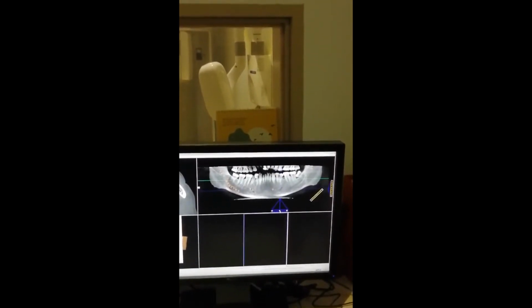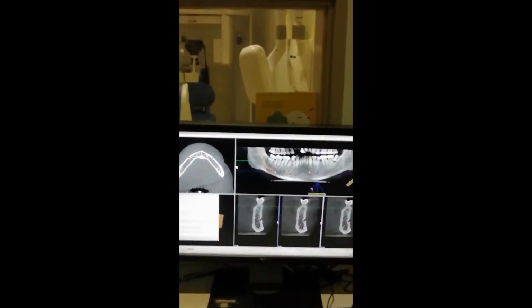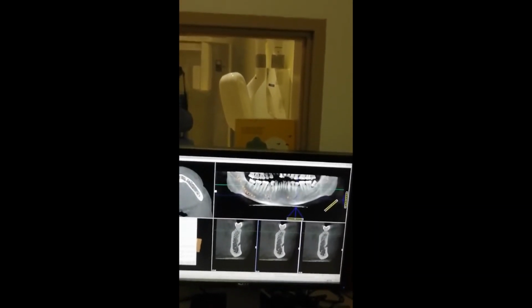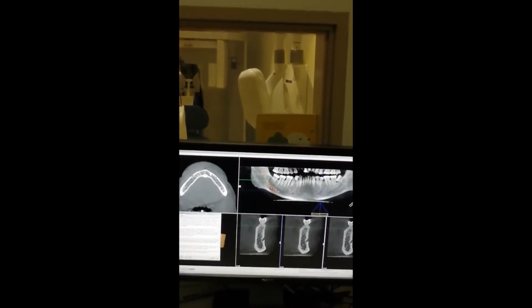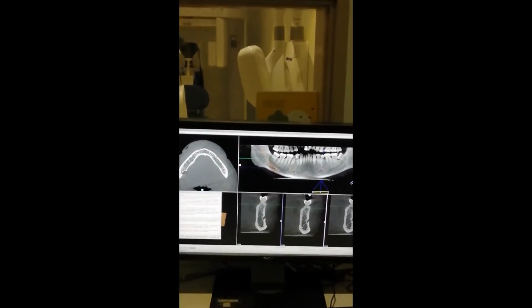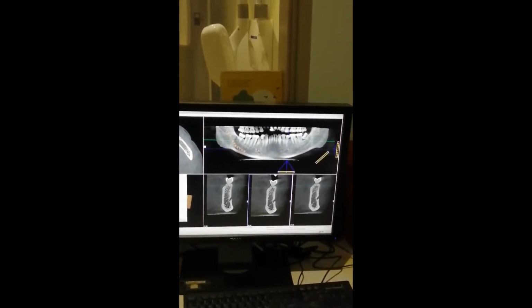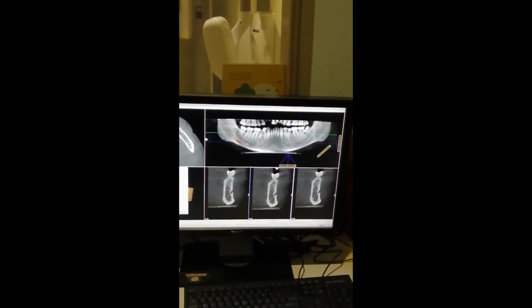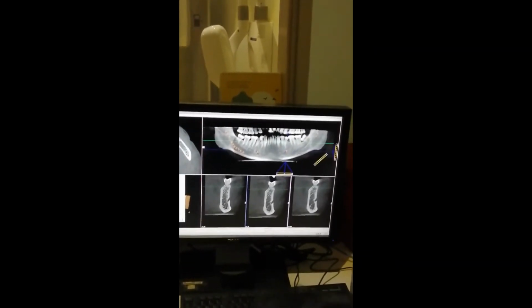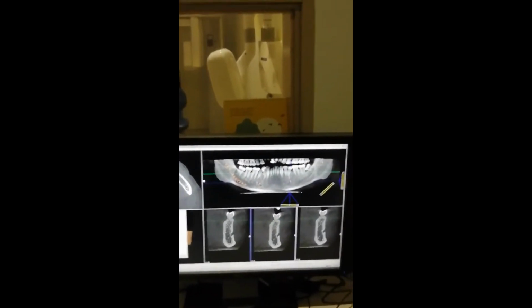Incisive canal. Yeah? It's quite far away. Yes, that's correct. You are right, incisive. Okay. Remove last point. Yeah, incisive is here. It's here. Correct. Okay, so we have the entry and we have the exit. We have the entry and different manually selected points, and we have the exit. Now right canal, left canal, or both the canals. I'll click on both the canals.